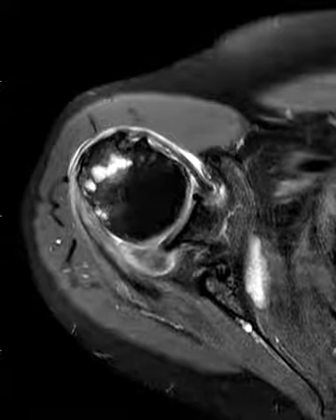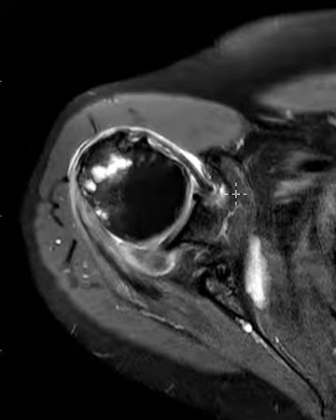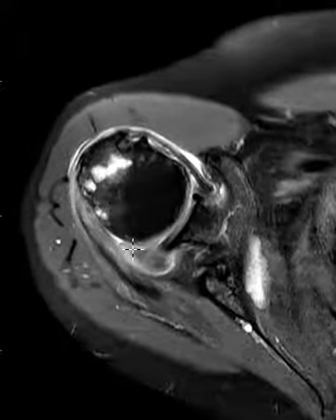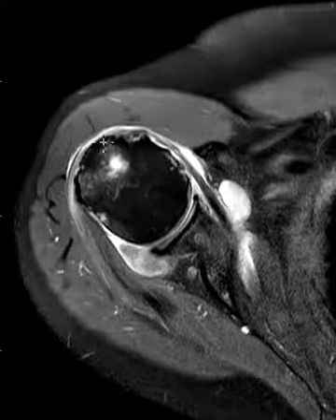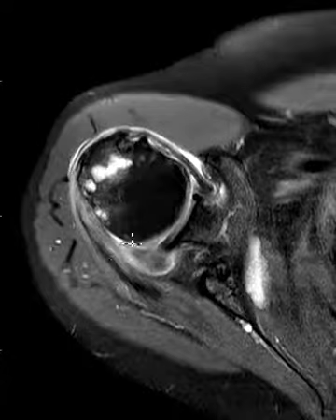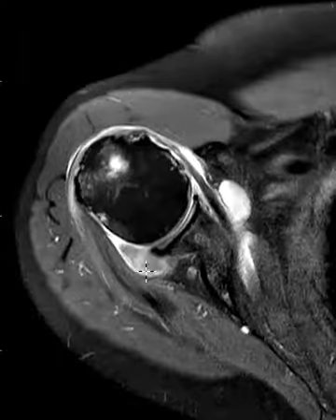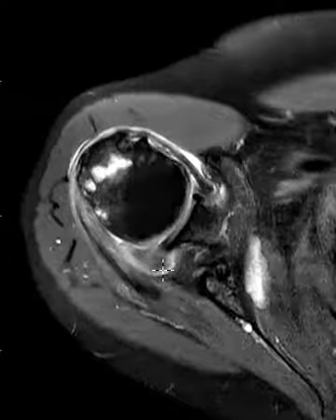Hello, this is Dr. Gay from First Look MRI, and this is a 62-year-old male with shoulder pain. They have rotator cuff tear and other significant findings, but they also have a funny region of abnormal signal in the posterior joint. This is the humeral head, this is the glenoid, here's posterior, and we see this area of what looks like low signal intensity surrounded by fluid in the posterior joint. And the question is, well, what is this?